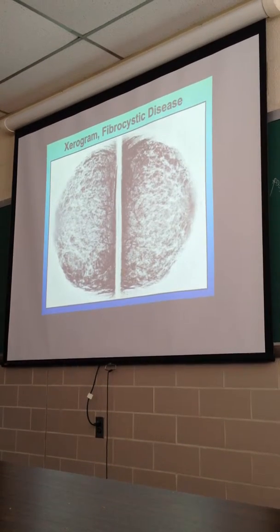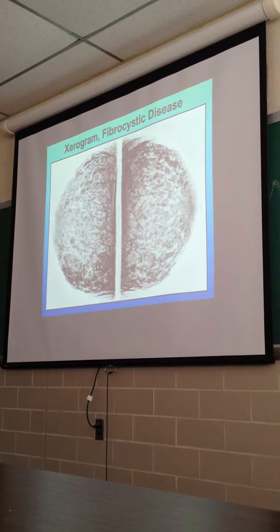You recognize fibrocystic disease? The irregularities there.